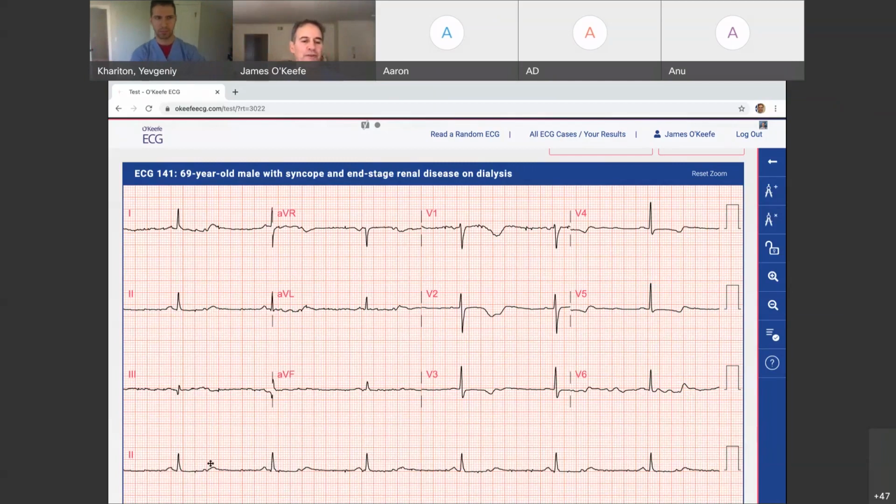So I'm sorry, ventricular phasic sinus arrhythmia. The PP interval shortens up when it's like 2-to-1 AV block. It shortens up when there's a QRS in between the PP intervals, and then when there's not a QRS, the PP interval is a little longer. Somehow that conduction to the ventricle alters the depolarization rate up in the sinus node. But in any event, look at this ST segment, it's really long here. Somebody with end-stage renal disease on dialysis.